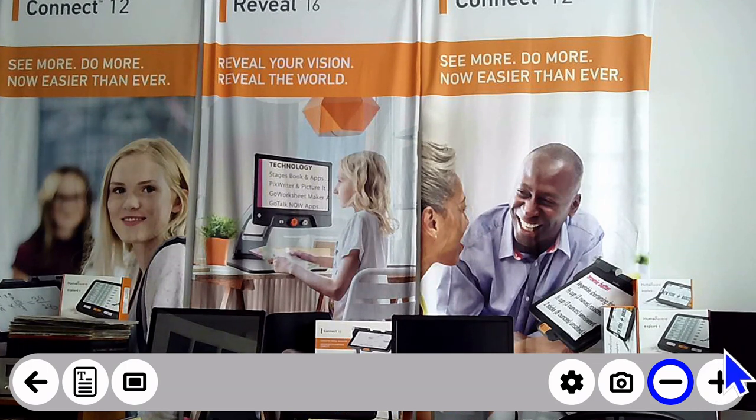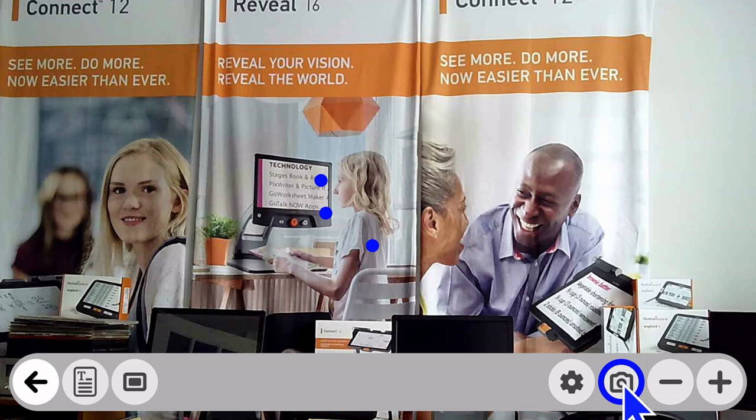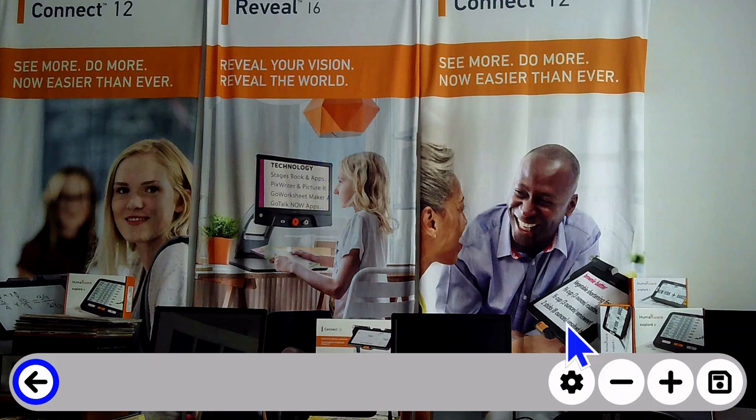Let's go back to our left one more time, and there is a capture option there. So let's tap on that one time, and we will capture an image of what we're seeing across my office here. So you'll notice that the toolbar has now changed. In the far right corner is a save option. That will save this image and then go back to a live viewing mode.